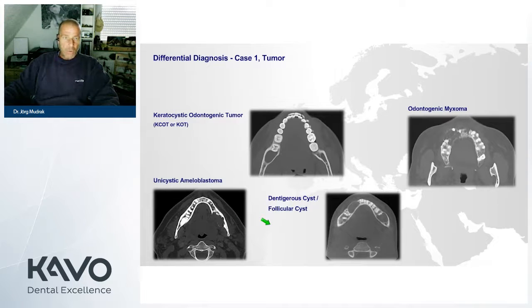Okay, I think now it's time that you start. You get approximately 1 minute, 60 seconds, to make your choice, what in your opinion the main diagnosis might be. I'm not talking about the lucent findings. And so I'm very curious to see what your opinion about this case is, and the variety of your ideas. So you still have 30 seconds left, so take your time. There is not that much hurry.